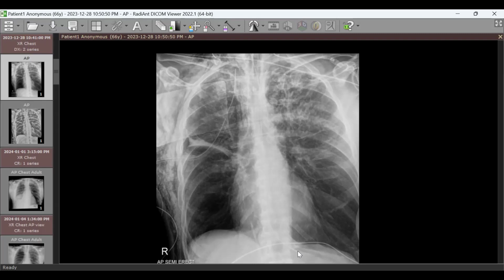Why do we want it that deep inside the stomach, not here? If it is in this position, feeding could cause reflux. Yes, and this would lead to aspiration. Great, thank you. So any other line you can see?